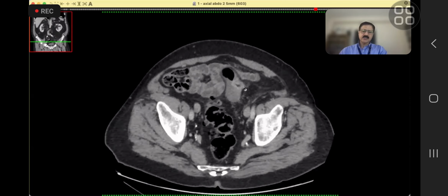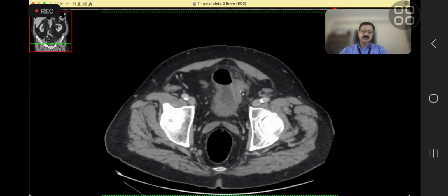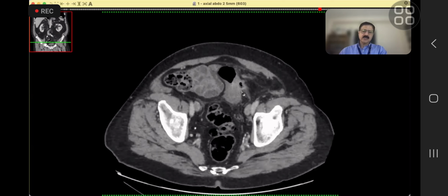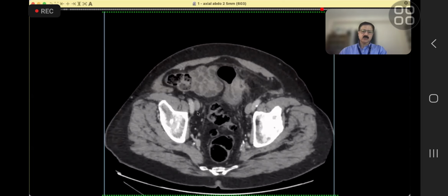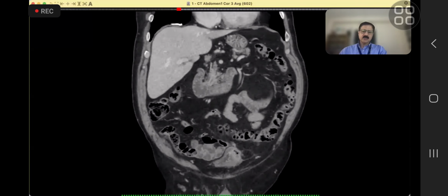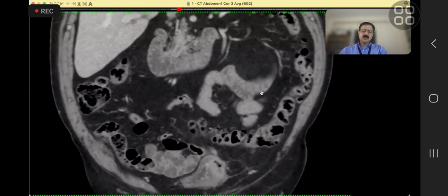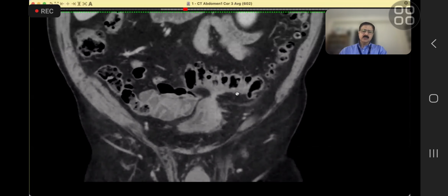Within the bladder, you can see that there is a lot of gas and there is perifocal fat stranding. So on an axial, you can make out that this is a colovesical fistula. Once you see it, it is absolutely justified to tell the examiner that in my routine practice, I will confirm it on other sequences, which is fine.